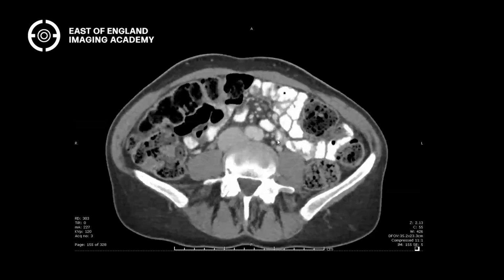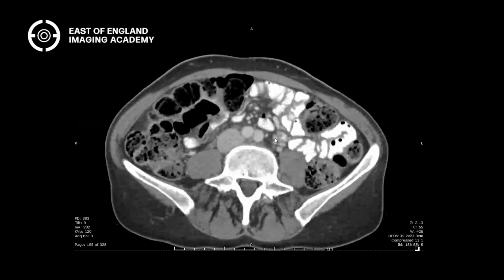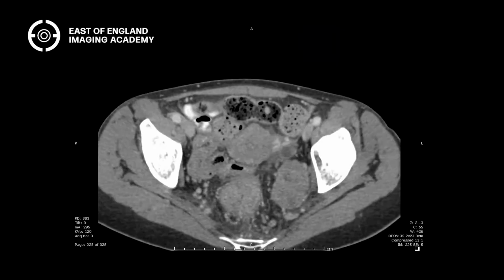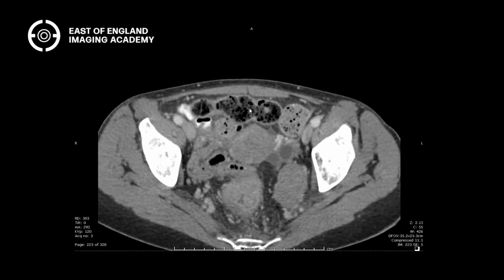So this is the IMV here, the inferior mesenteric vein. It's gone all the way up, almost to the point where the aorta bifurcates. So it's quite extensive. So this is a rectal tumor. Okay, so you've now diagnosed a rectal tumor with liver and lung metastases. Yeah, you see how this is basically our job. As radiologists, this is what we do. This is our day job.